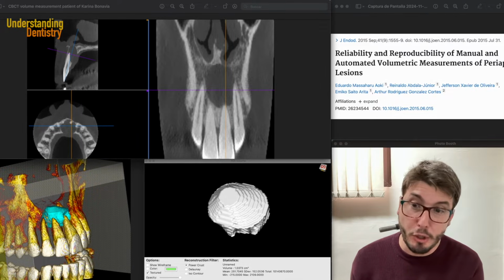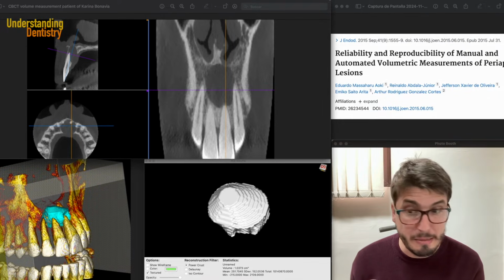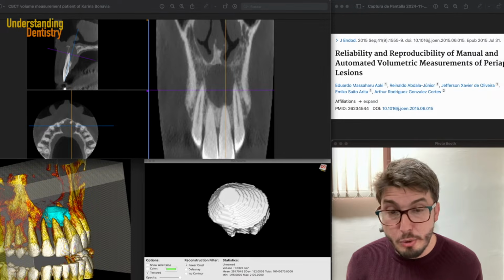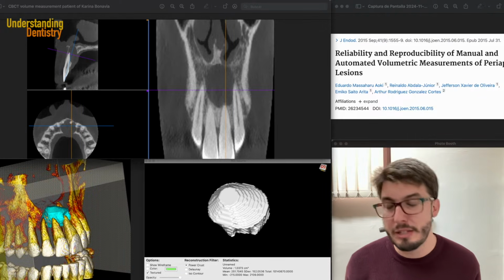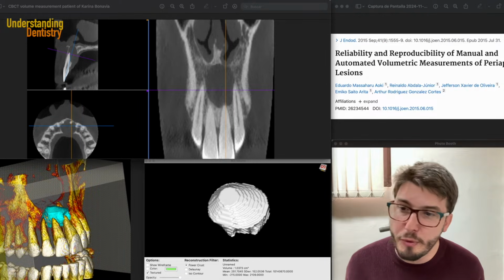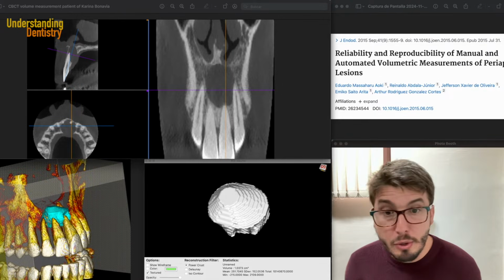Furthermore, you would like to do the calculation because you can even see the volume of the lesion in 3D, like in the bottom left corner of this screen, this image. So to plan the surgical removal, it's better if you can see in 3D where the limits of the lesion are, right? So that's another usefulness of this method. Well, so let's see how to do that.